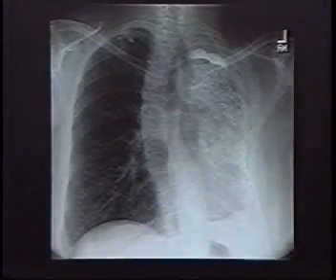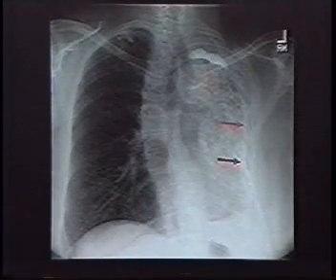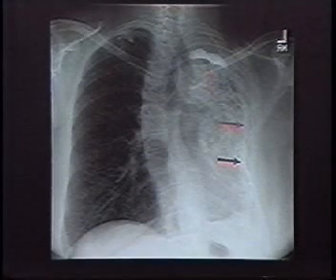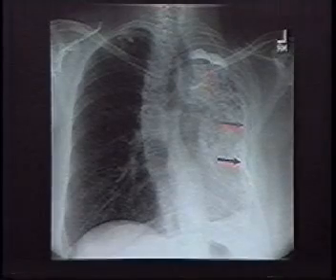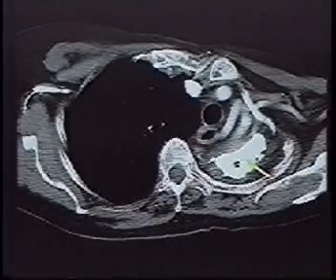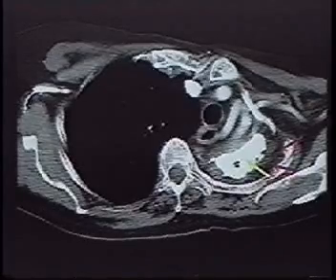Here's a radiographic example of a patient with fibrothorax. Note the extensive pleural calcifications, which are displaced away from the ribs by marked expansion of the extrapleural fat, as well as decrease in size of the ipsilateral hemithorax. On CT, again, there is extensive pleural calcification with expansion of the extrapleural tissues. There is also a decrease in size of the ipsilateral hemithorax.